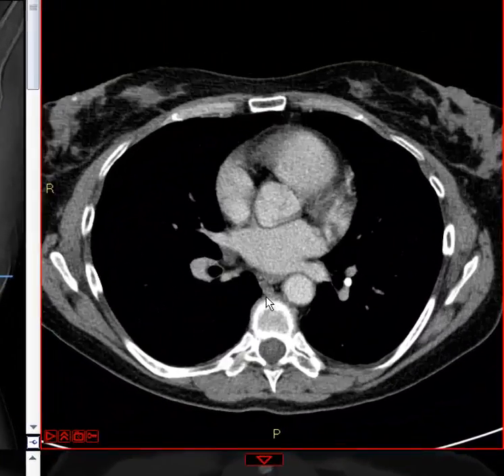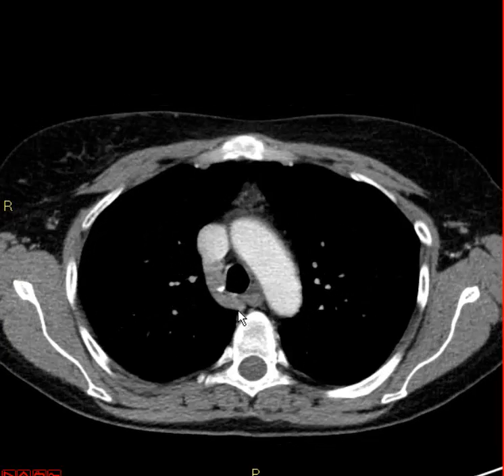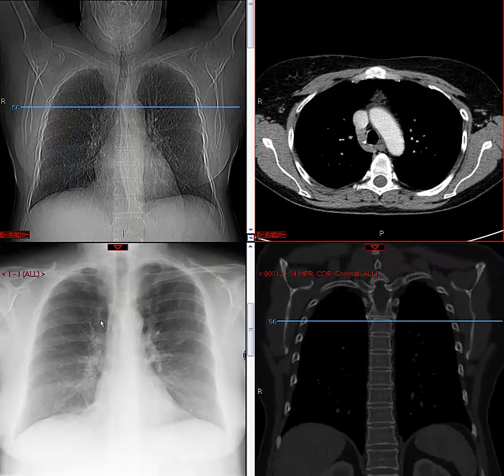And as we follow the azygos vein to that area, you can see the azygos ascending, and then here's the azygos arch, and then you see it empty into the superior vena cava right here. And it's where the arch makes its way around the trachea right here and becomes a little bit more lateral. That's where it becomes visible here. And because it's visible, it's one of the things you look for with certain chest disorders such as congestive heart failure, and when the venous pressure increases, you'll see some widening of the azygos vein right here.